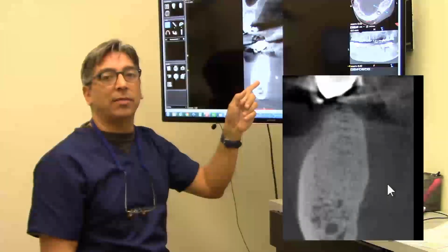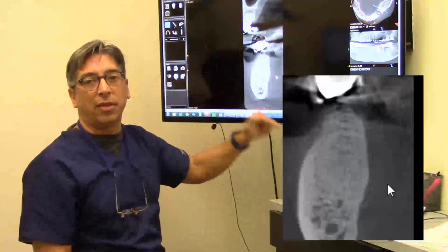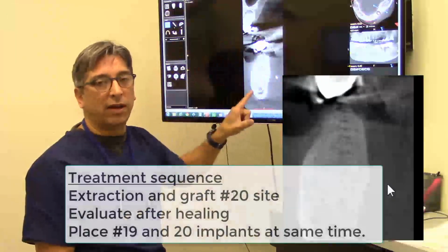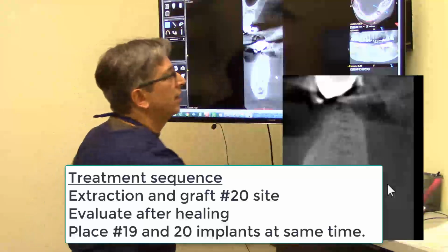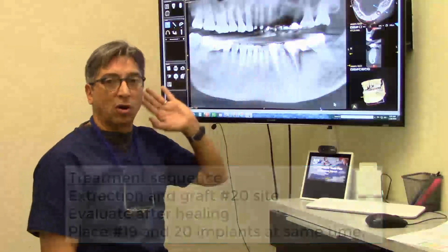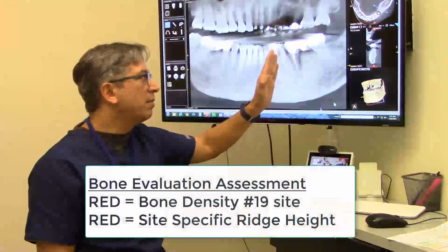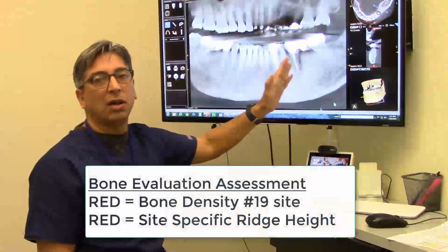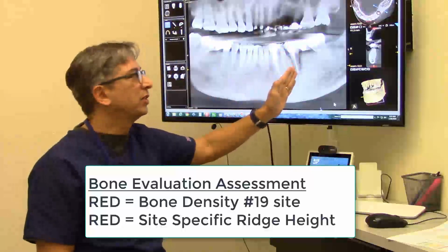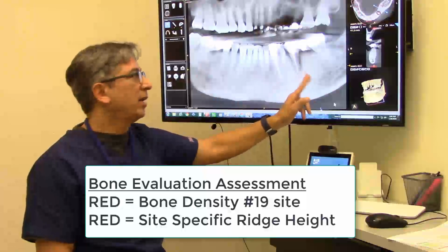and I would give him a red on the other site until I see the bone there. Then I reevaluate that site and make sure that we do have bone there. So this site, this whole case, if the treatment plan goes towards an implant, this is a non-starter for me. I would make sure I let that patient know that the time and effort to get an implant in here is going to be long and arduous, and then here you had to cross your fingers on the red here.